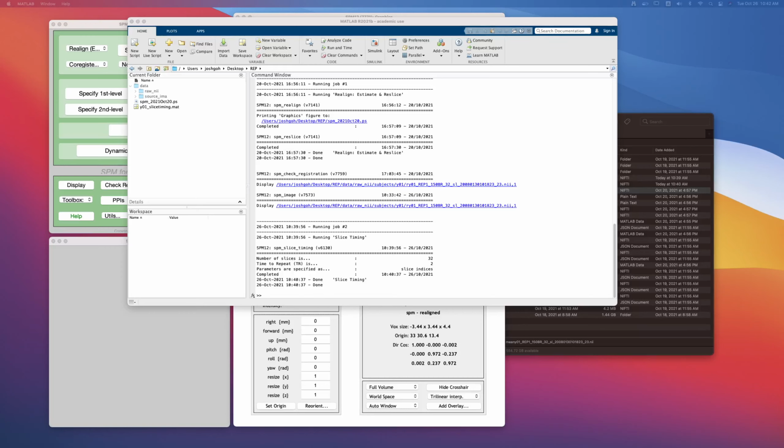Okay, after doing slice timing, the next pre-processing that we usually do in our lab is to co-register. Remember, co-registration, as we talked about in class, is about registering two images in a rigid body algorithm, where the two images might be of different modalities.